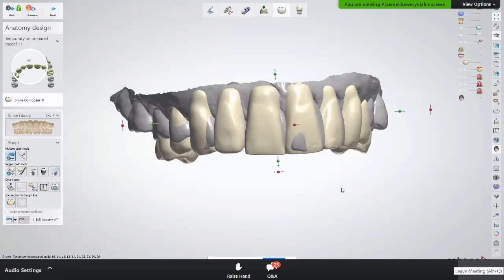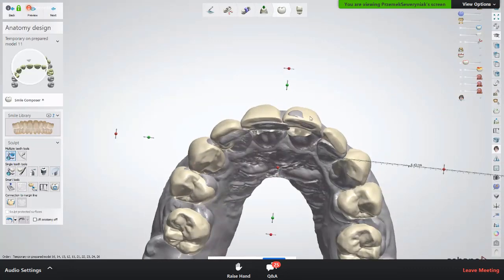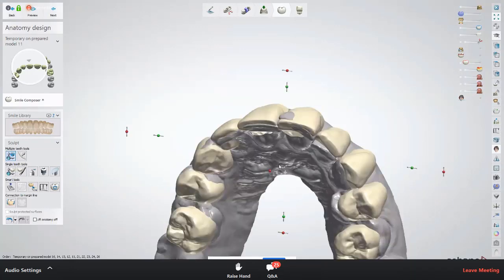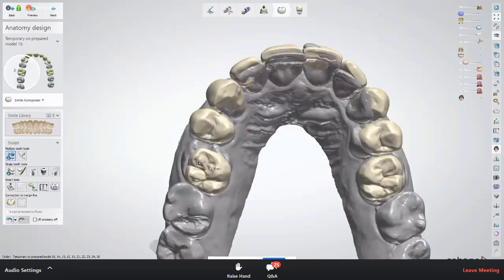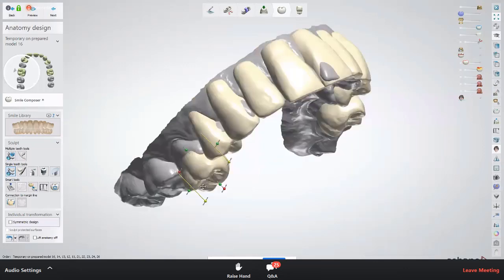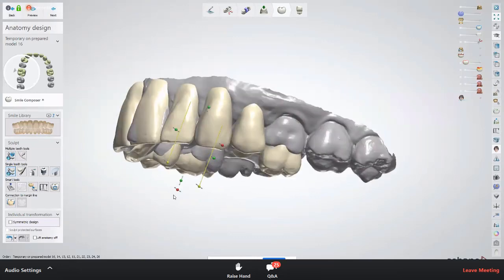And if I'm actually clicking my shortcuts, then just ask me what button I'm clicking here. But this is the global transformation, basically, first of all. And as you see, the molars didn't change, so I have to change those one by one also to a bigger one. Anyway, I'm going to just design for some veneers. I'm not going to use the occlusal surfaces at all.